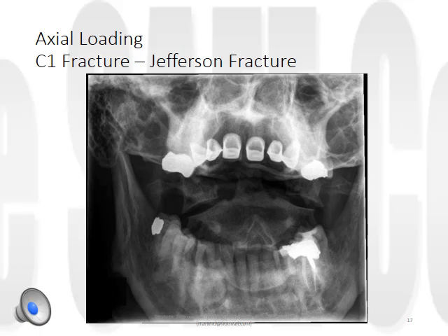So now we'll move on to looking at some pathology. For the X-rays and CTs, we're going to now be focusing on trauma pathology, and we'll go by mechanism. So first, considering axial loading. This is an example of a C1 fracture, a Jefferson fracture. Obviously, you'll have all sorts of different views. I'm just showing you some of the best views that you can look at each type of fracture from.